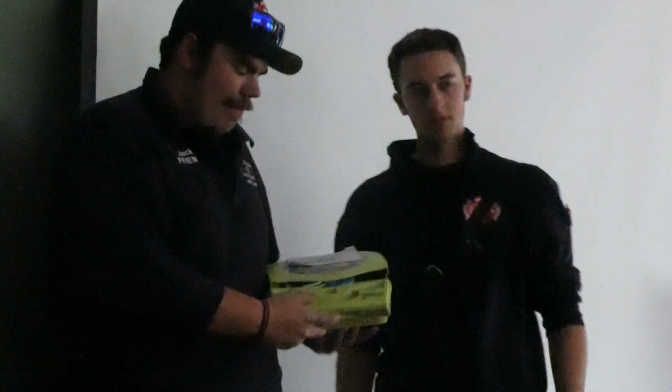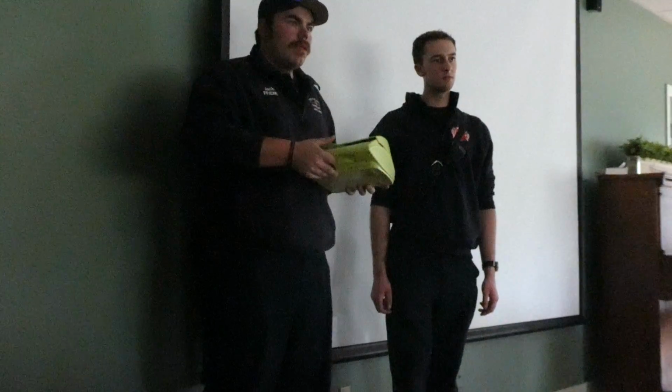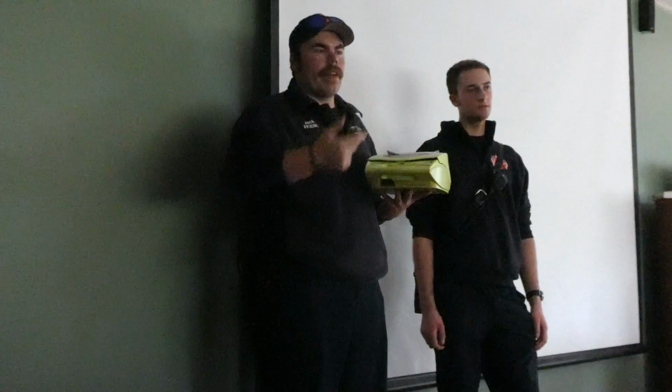Just put them on. Say like the one that you had back here, if someone needs it, it's only good for one time? You'd have to recharge it or put new pads on before it can be used again? Yeah, so they're one-time use. You can get new pads for them, and I think they're lithium-ion batteries. So you just put the new batteries in, put a new pad on, and they're good to go. And you can call the company if you use it to get new pads and batteries.